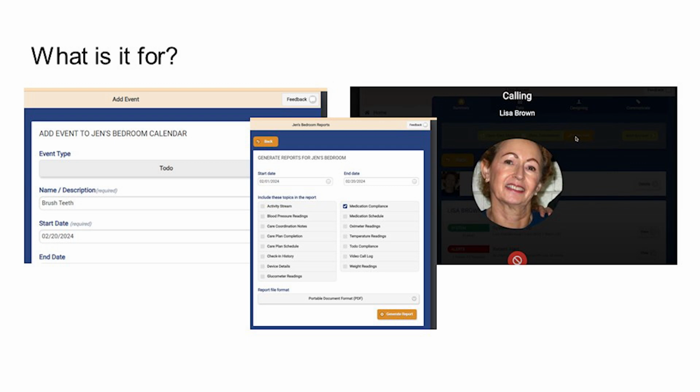And finally, if you want to reach a member that has a touchscreen in the residence, you would do it through the portal, going into the portal and then initiating a video call to that member from the portal. And these are 3 out of thousands of examples of things that one can do, especially depending on the different kinds of roles one may have inside the portal.